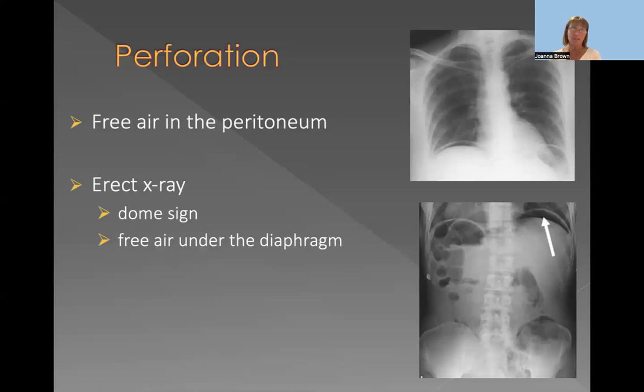For the last part of my presentation, I would like to concentrate on the air outside. So not within the lumen, not within the wall of the bowel, but free air within the peritoneum, which is consistent with perforation. And again, perforation is a surgical emergency, and we should be treating these children and any patients really quickly, taking them to theater.